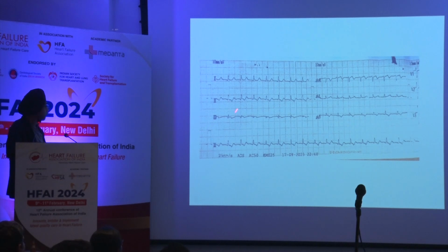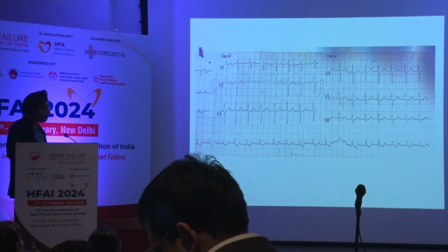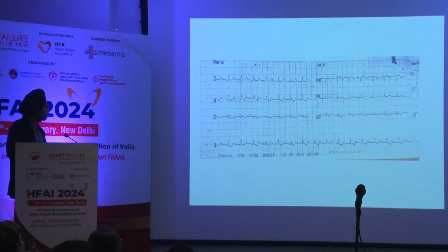So you see, these are the T waves, clearly peaked, nothing here. The narrow QRS rate you can see about 140, and she's uneasy. These are the chest leads, and she is in the age where you have to suspect everything. There are some ST-T changes here, more ST here. You see this V5, V6, right? Go back to the same ECG.